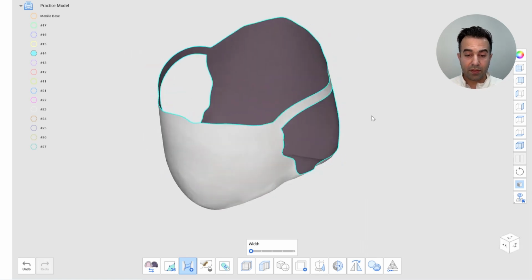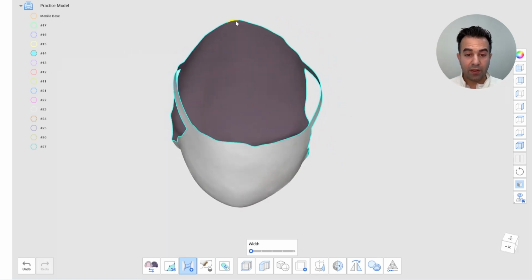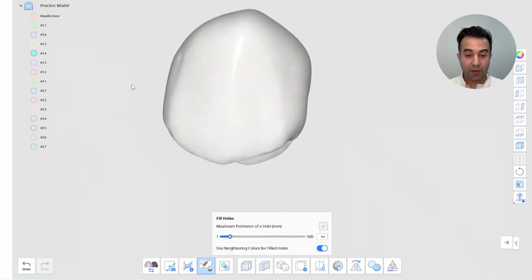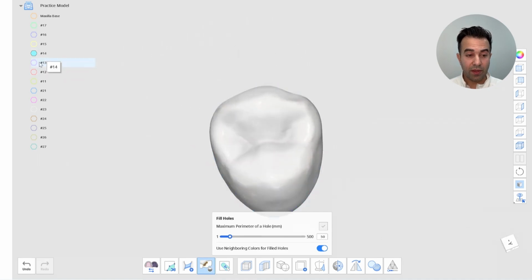However, the time that you'll spend on this process is an investment because you do it only once, and then you'll be able to save these 3D teeth in your MeditLink or even on your local PC.